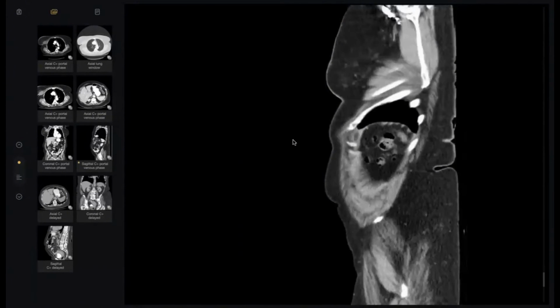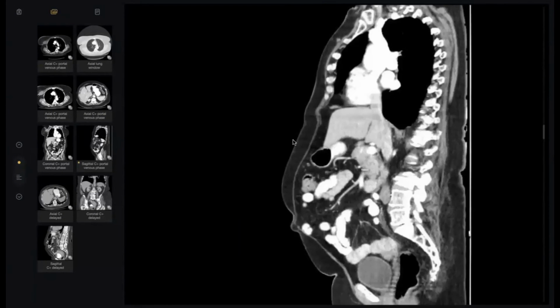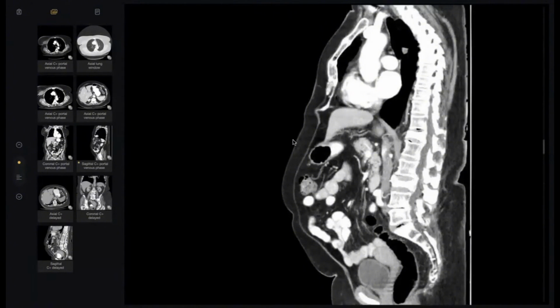Fine. Okay. So in my routine practice, I would like to check for the bones, checking for metastasis. I can see that there are multi-level vertebral compression fractures with retropulsion. One question: could you differentiate or give me a clue? This L3 compression collapse here, what do you think is the cause?